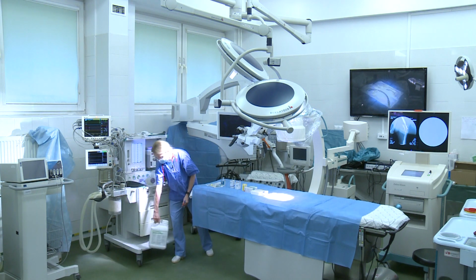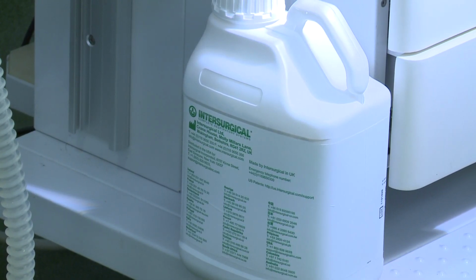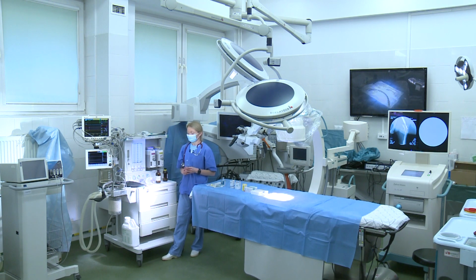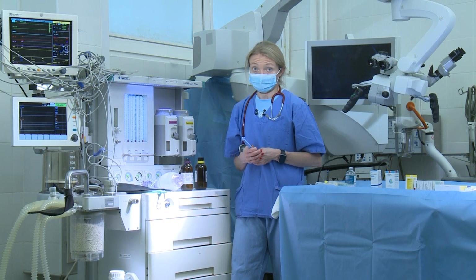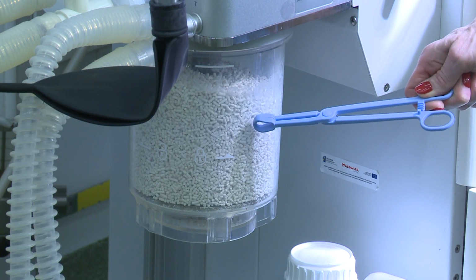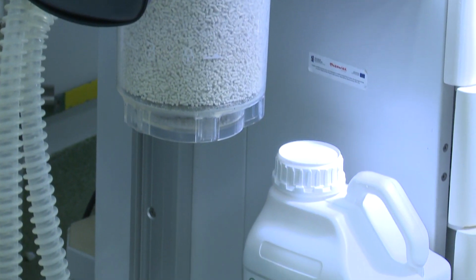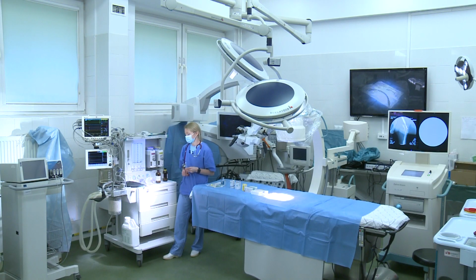You can buy it commercially, from different companies and in different colors. What does it mean? Soda lime has its expiry time, so after 8 or 10 hours of constant anesthesia, it does not absorb the carbon dioxide anymore, and we will recognize it by the color changing. Inside, there is an indicator. It is going to change color when it has expired, and it is extremely important to change it on a regular basis, because we don't want to suffocate our patient.